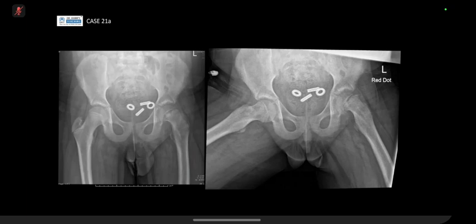If I draw the Klein line, it's not crossing the femoral head, and it's more prominent on the frog lateral view. So findings are suggestive of SCFE, slipped capital femoral epiphysis, at the left femoral head, where there is widening in the growth plate, and the left femoral head epiphysis is moving posteromedially and not intersecting the Klein line.